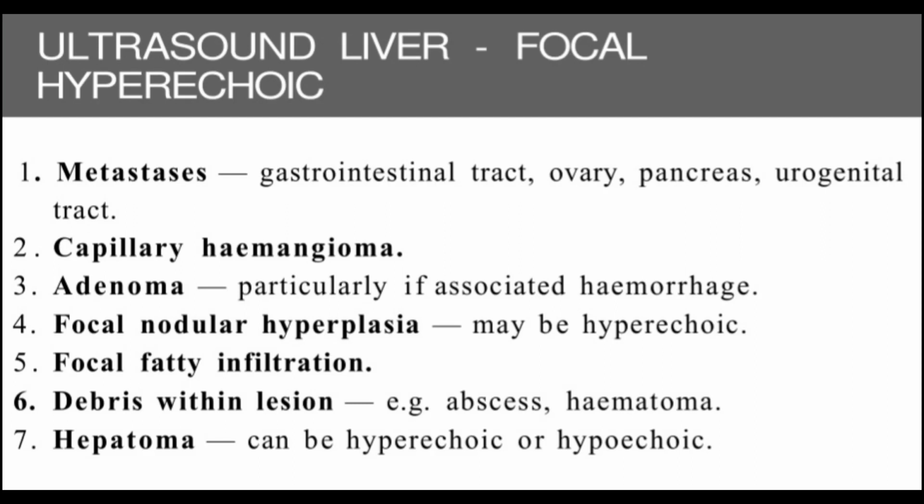Focal nodular hyperplasia happens to be hypoechoic nodules, but in a few cases these may appear hyperechoic because of the central echogenic scar within the tumor. Focal fatty liver infiltration should not be confused with a mass. It appears in a normal liver. There will be no diffuse fatty infiltration, but some areas will have increased deposits of fatty content, and it will look like an echogenic mass within the liver, but actually this will be focal fatty liver infiltration.